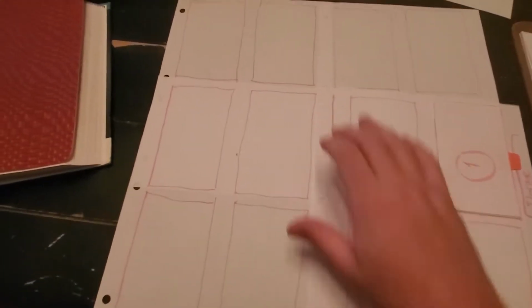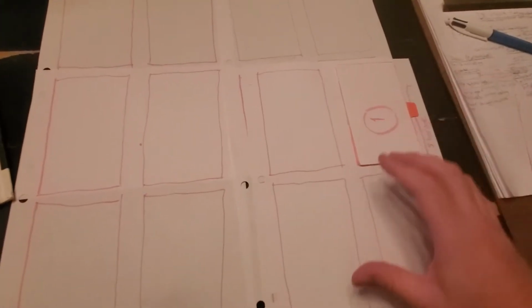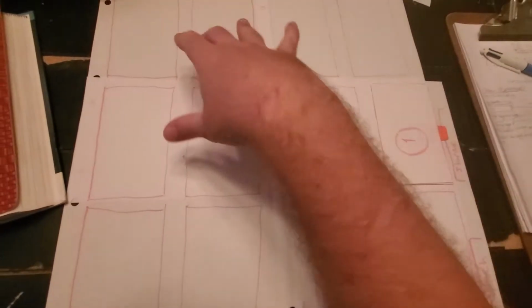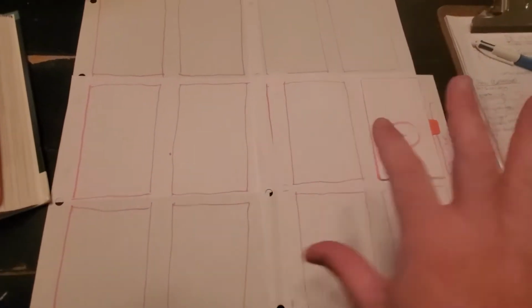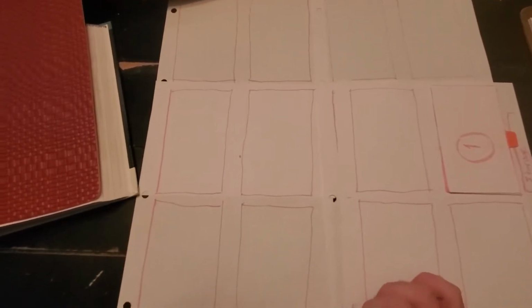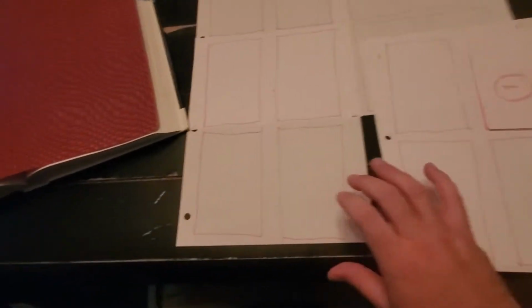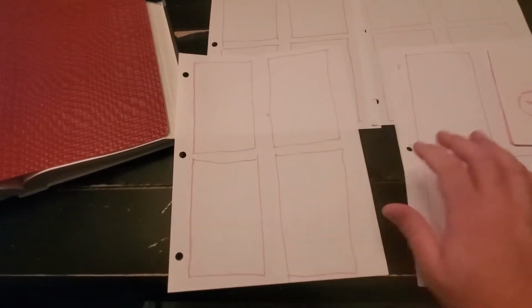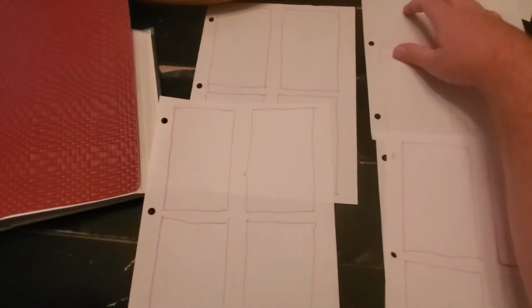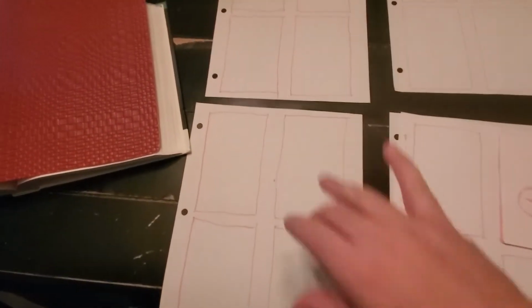And on this Del, you have 1, 2, 3, 4. You've got 4. Well, actually, you've got 12 pixels, right? And if you have an adjoining Del, we'll spread this apart here. Let's say that this is one Del with 4 pixels. We're going to say that this one over here is another Del. We're going to say that this one over here is another Del.